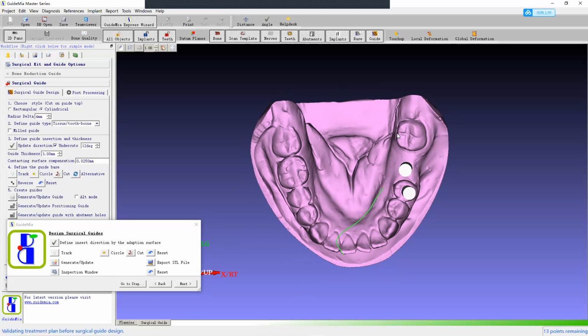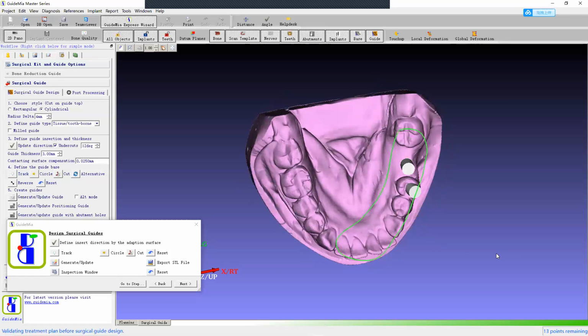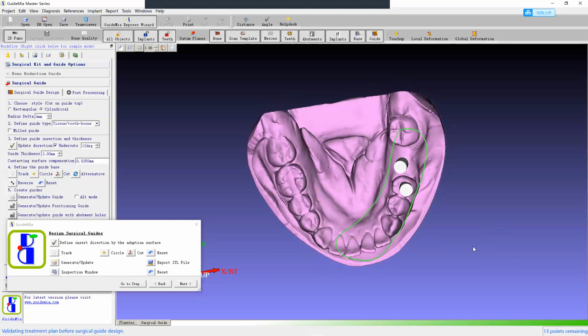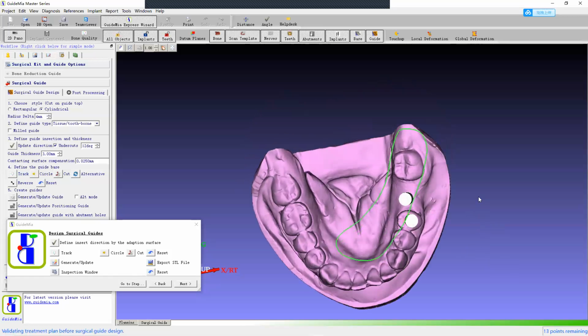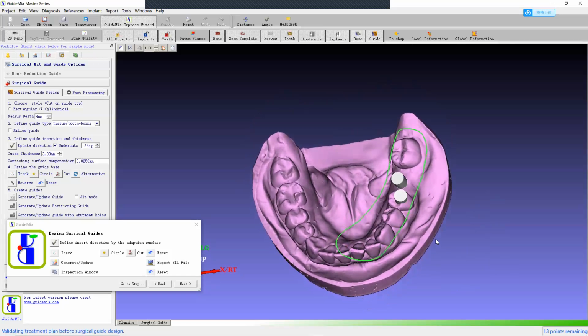At this time we don't rotate the view. It's something like a cookie cutter. So I draw the profile. If you see here, I rotate the screen. It's not going to follow. What we do is we do this, and I couldn't put it in the right position. Let's say we just do this.